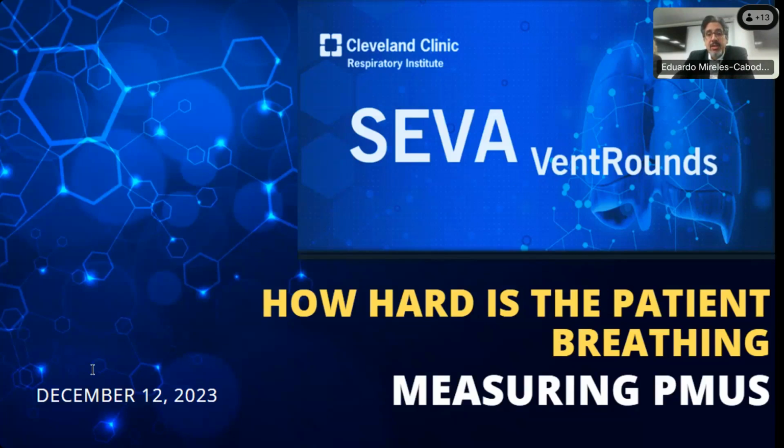Okay, let me change the screen. There. So this is the example that I have put here today for all of you to assess and to learn together. This is a screenshot of a patient. You'll see that we did this from the exporting screen from the ventilator, but it contains the same information.